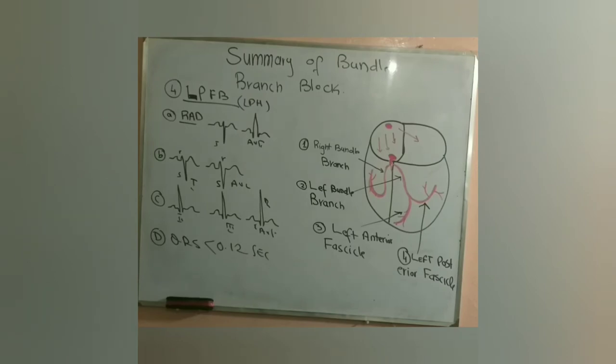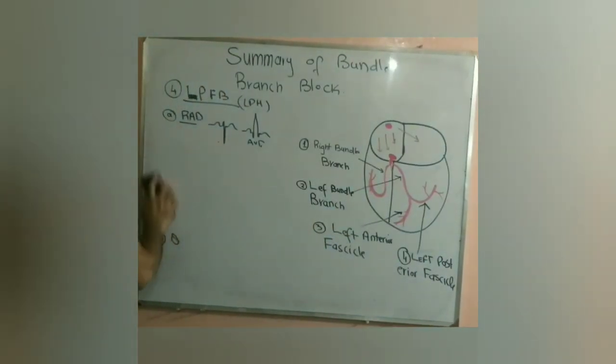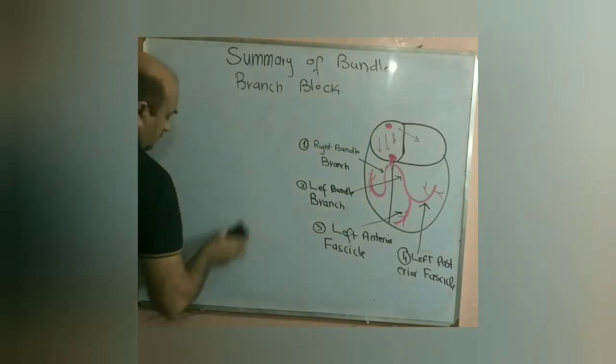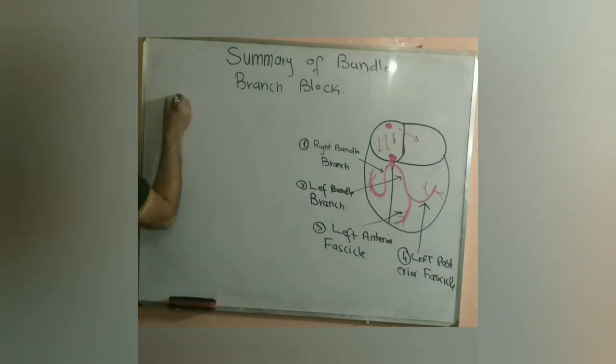Then there is bifascicular block. Now we are done with these blocks. Here comes the bifascicular block. What is bifascicular block?